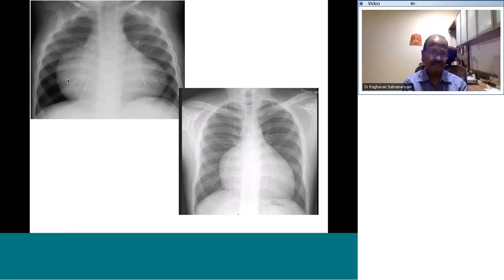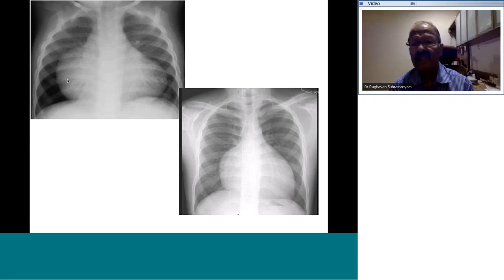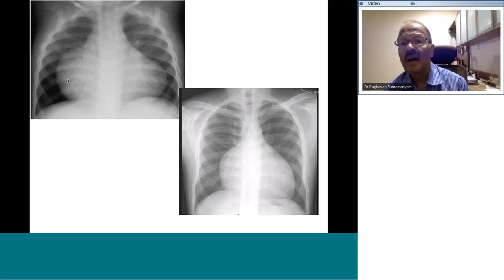Yes, I'm waiting for your opinion on this X-ray. I think I have another 5 minutes to go. Yes, you got to be fast now. The more slides you can answer, the better it is for you.